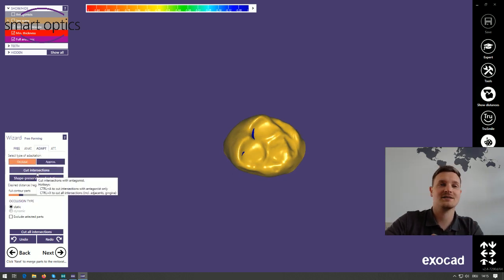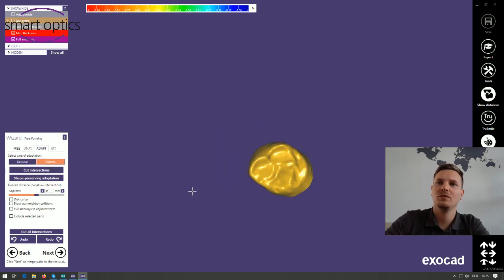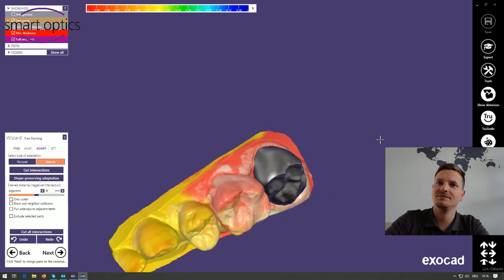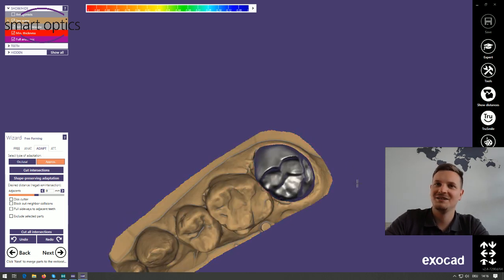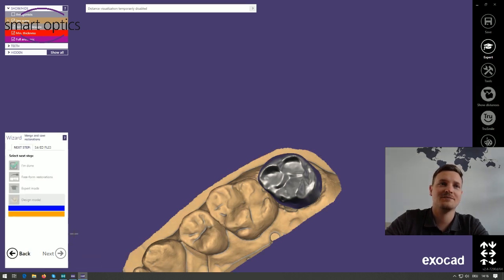So just my personal way to do it, but I think that works very fine. Okay, it's a crown now. Okay, perfect. So just go next, and now I'm done.